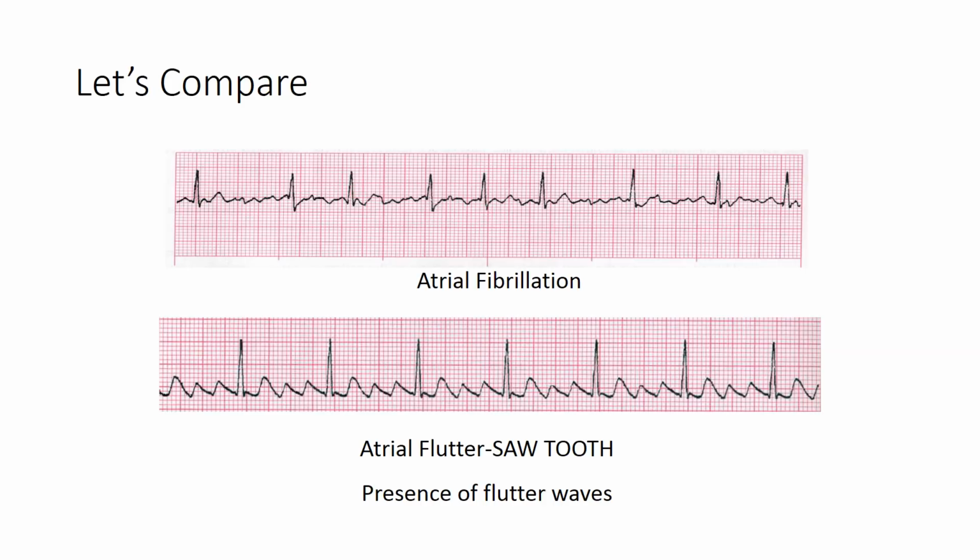The frequency of those F waves is very, very fast, and in this atrial flutter example, our AV node managed to control that ventricular response to that rate pretty well and pretty consistently. And actually, if you look, both of our AFib and A-flutter examples here are what we would call controlled, because the heart rate, when you count those R waves, is less than 100.